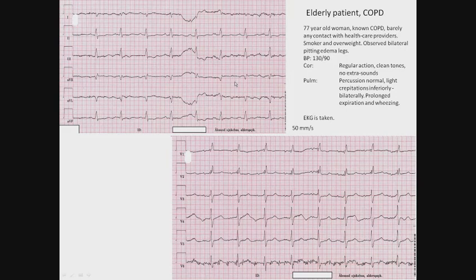Alright, so the first thing we address, according to our 5-step method of methodically interpreting ECGs, we check for the frequency. And one difference between 50 and 25 mm per second strips is that on a 25 mm per second strip we jump one big block for each number in our row: 300, 150, 100, 75, 60, 50. But since this is a 50 mm per second strip, we jump two big squares. Alright, so let's check 300, 150, 100.